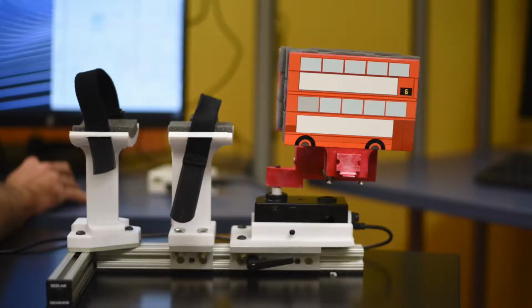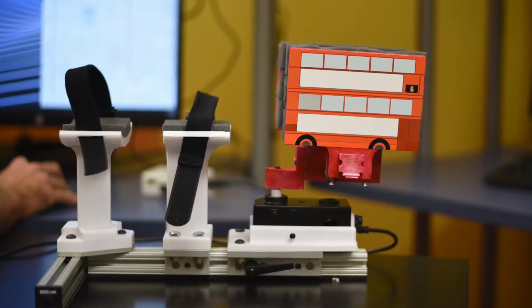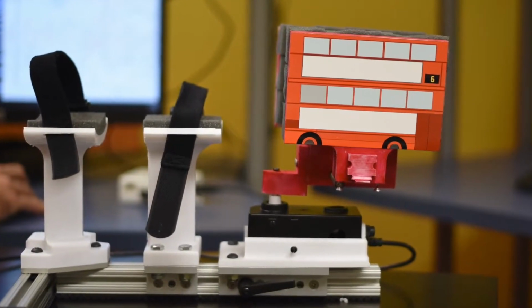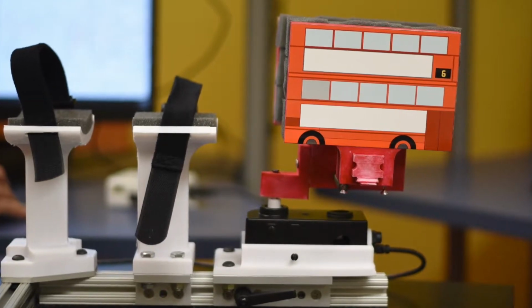Our team developed a device in collaboration with the Sanger Lab at USC to analyze wrist angle measurements from a prompted user interface coupled with EEG signals in patients with dystonia. The Sanger Lab, under the direction of Dr. Terence Sanger, aims to use engineering principles to understand childhood movement and to discover new treatments and enabling devices that will improve motor function in children with developmental disorders of movement.